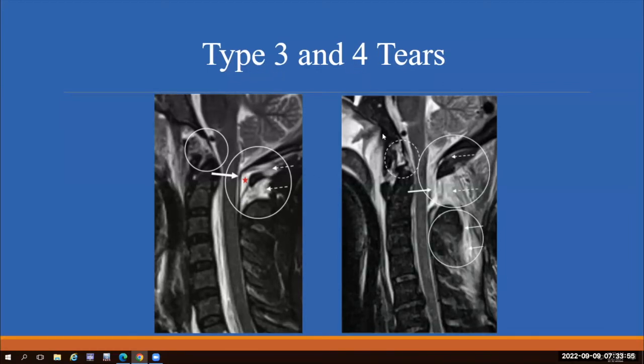And then a type 4 injury is the most catastrophic one. That's generally when you have through-and-through disruption of the fibers. The posterior dura and the ligament are absent, and there's fluid everywhere. There's no black line coming down here. You can see we still have the dura intact here, this little atlanto-axial ligament, and this one is completely gone. These type 3 and type 4 tears are much more likely to be associated with other craniocervical junction ligament tears. You can see up here the tectorial membrane's torn, and there's gross disruption of the atlanto-occipital joints. So these tears are more of an indication of a high-grade injury.